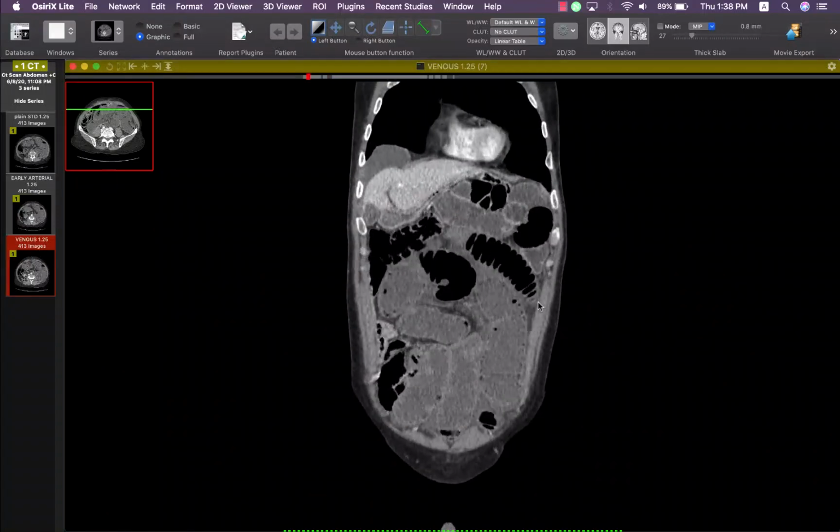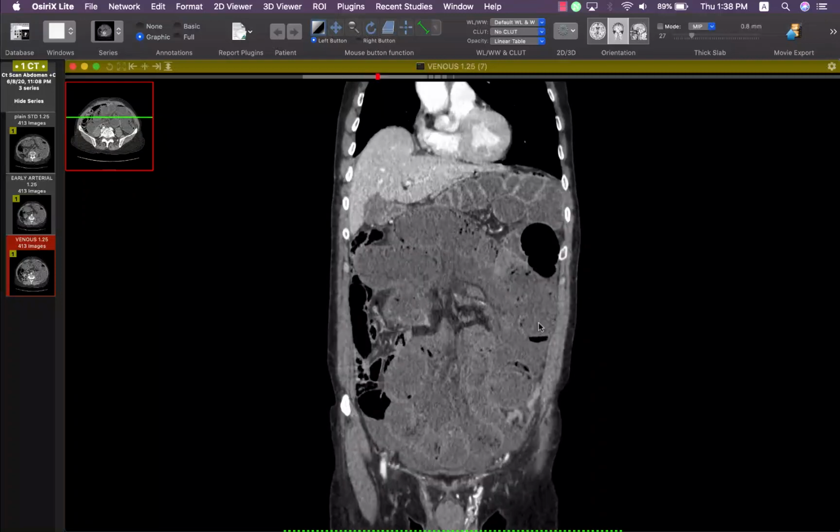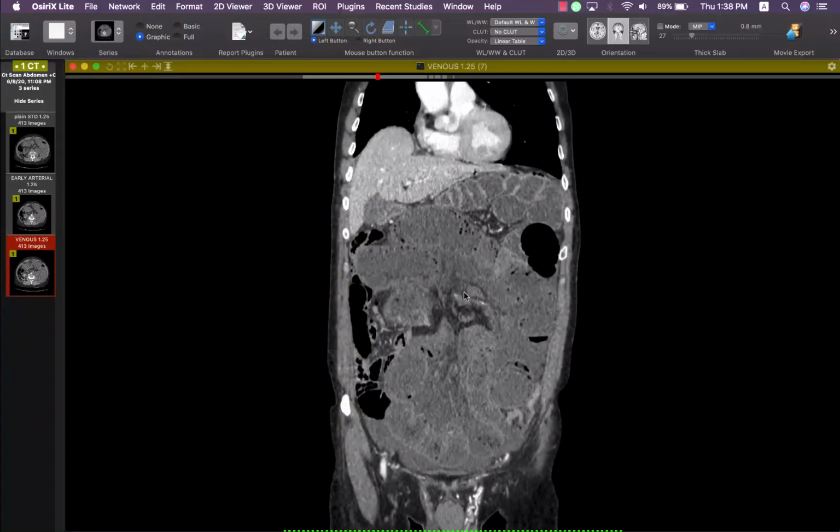And again, ischemic bowel is a frequent complication of the closed loop obstruction, especially the transmesenteric type of internal hernia. If it is the underlying etiology, it is usually complicated with ischemic bowel.